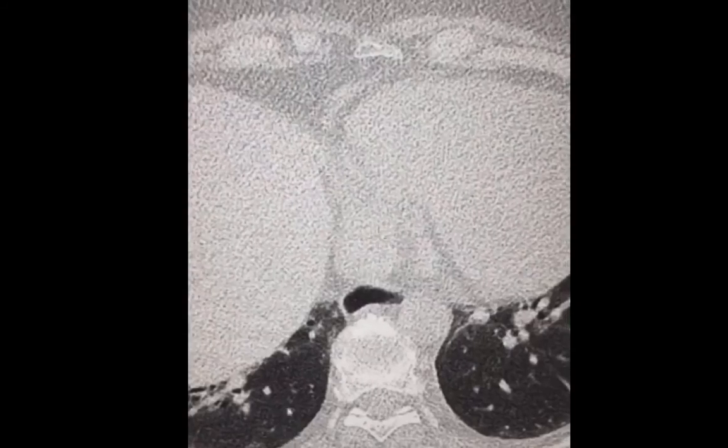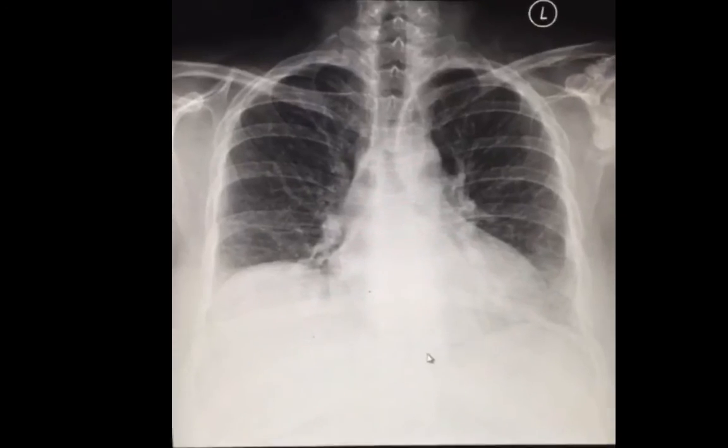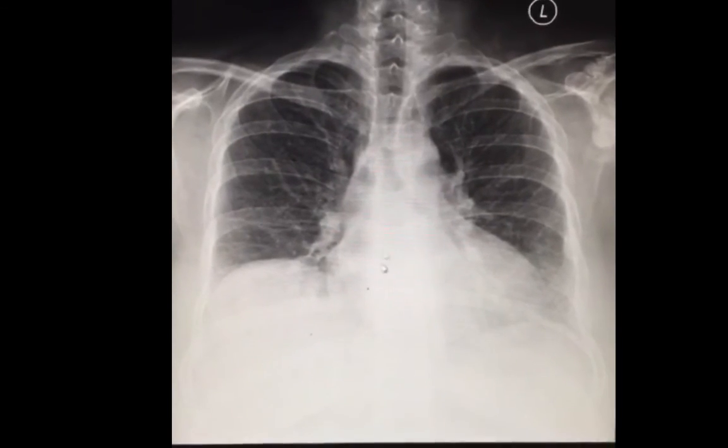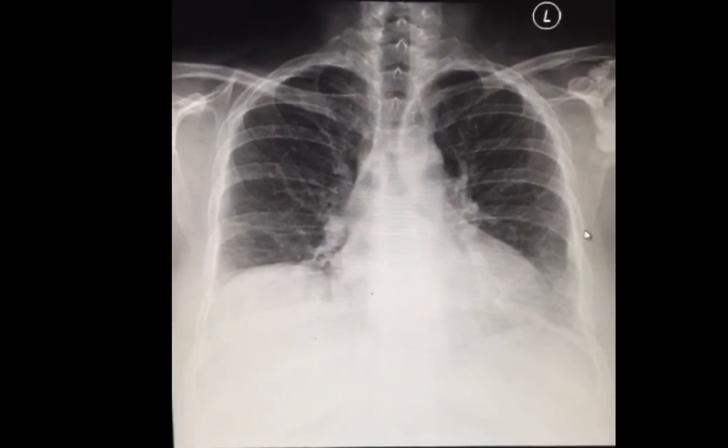NSIP. Have you noticed the mildly dilated esophagus as well? And this is the soft tissue calcification that we saw surrounding the shoulder joint on the chest radiograph. Given the NSIP pattern, the esophageal dilatation, and the presence of soft tissue calcifications, the final diagnosis is scleroderma.